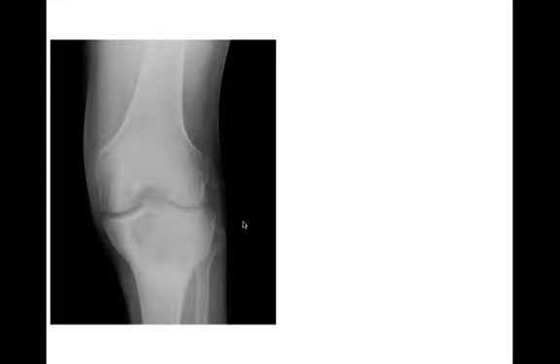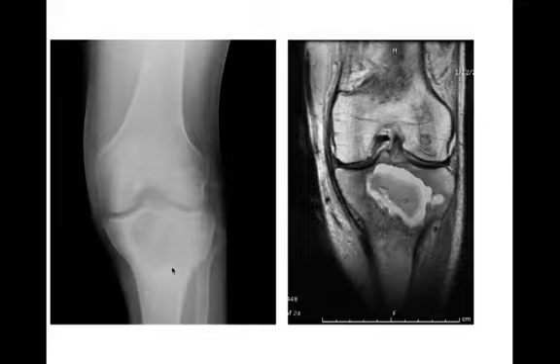Here we go. We have a frontal radiograph of the knee. We've seen this one already. This is a geographic lytic lesion, narrow zone of transition. I think it has perhaps a slight sclerotic border. And this one is centrally located in the epiphysis and the metaphysis of the proximal tibia. This is just the MR to show you the location of this lesion again. So here it is, a geographic lesion. You can see it spanning in from the epiphysis, growing into the metaphysis. Fairly narrow zone of transition even on the MR.